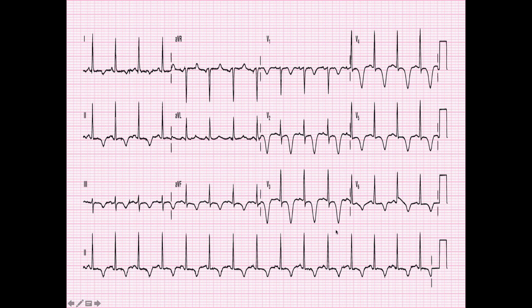So we've got signs of left ventricular hypertrophy, signs of left atrial enlargement, signs of right ventricular hypertrophy, but here we are focused on our T waves, and they are flipped all over the place. Holy moly. And what is this? Well, this is a right ventricular strain pattern. I've got right ventricular hypertrophy, ST segment depression below baseline, and a flipped T wave. So why is my T wave flipped? Because it's a right ventricular strain pattern, because we have right ventricular hypertrophy.